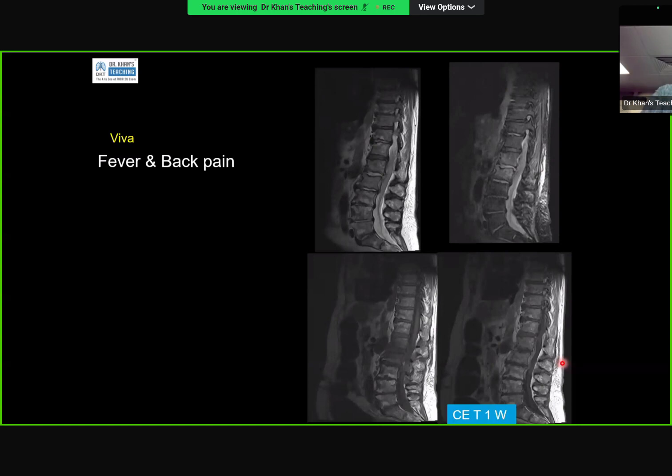Exactly. So this is what it was about, this case, this finding. And this is an extremely important finding. It is extremely important in head and neck also. By the way, it is extremely important in the liver also. But let me give you the context. When there is an infection, there is liquefaction. When liquefaction happens, then there will be a liquid component, and the margin will enhance. That is drainable. Before that, it will not be liquid. So you put in a needle, there will be nothing to drain.